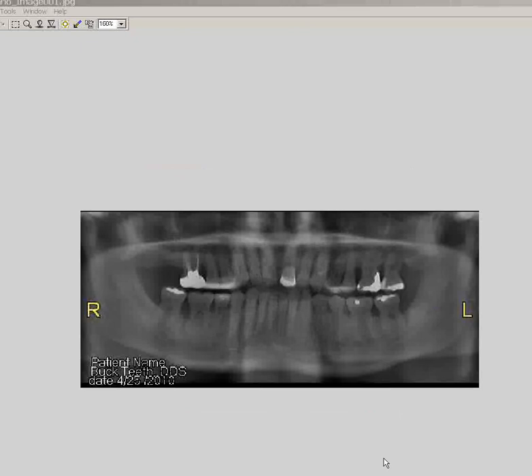Okay, so now that that's been performed, we've cropped out the black borders, and so when it's printed, you're not going to use up extra toner, and that's a really nice feature to have. Then we can also, by the way, edit the fonts. If these fonts are too large, if you don't want such a large font, we could lower the fonts before we captured, and so you have smaller names and numbers if you wish.